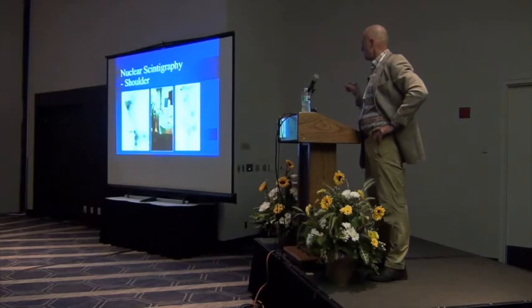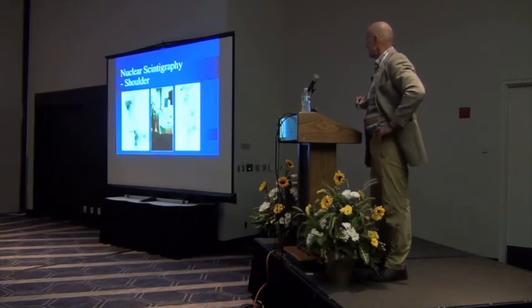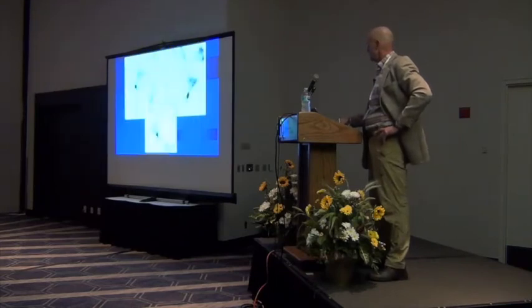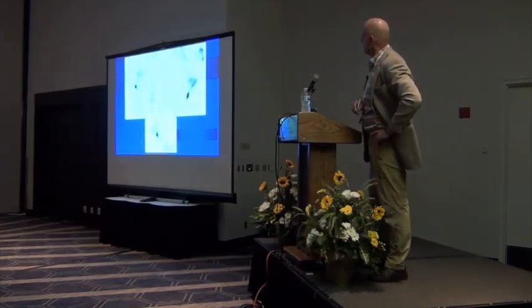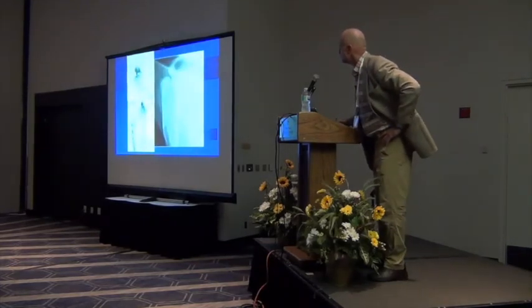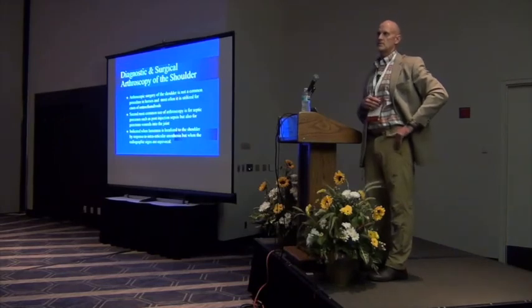And obviously stress fractures such as that one, and that's not a stress fracture, that's actually another one of those enthesis changes in the neck of the scap or the supraglenoid tubercle. And then just the variety of different things that we can see with the bone scan. Any questions? God, I didn't even get to talk about surgery.